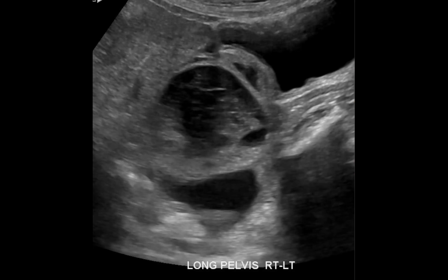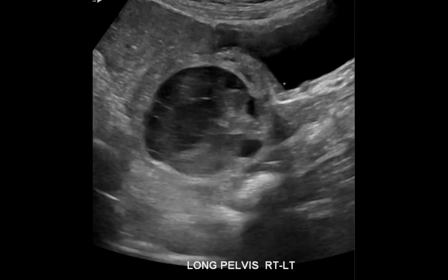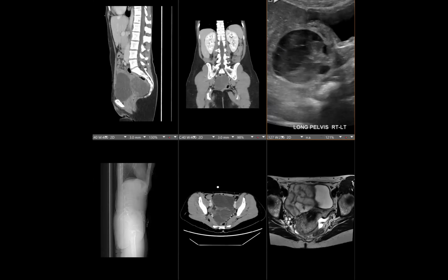Is there any flow in that? You said the MRI was just a few months prior, right? So it's probably not a malignancy that developed. Correct. So it's new. Yeah, so maybe an endometrioma. Oh wait, in a torsed ovary. Good. Yes.